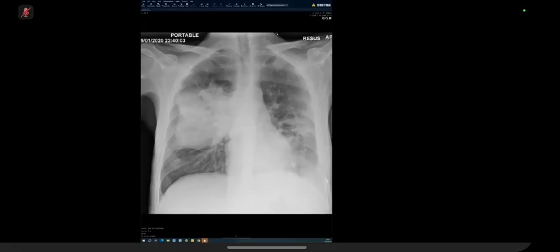I cannot see any cavitation within. The other one is in the left lung field in a lower zonal and more peripheral distribution. We cannot detect any gas in the lower recess, no pneumothorax. So I am dealing here with a case of bilateral lung opacities.